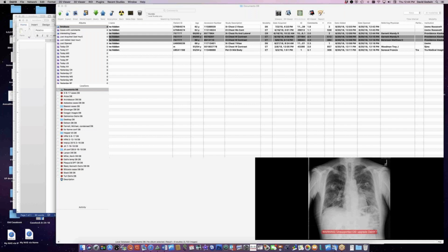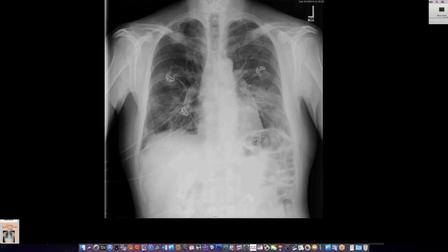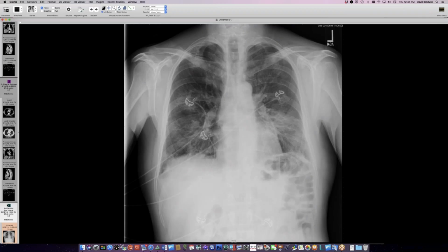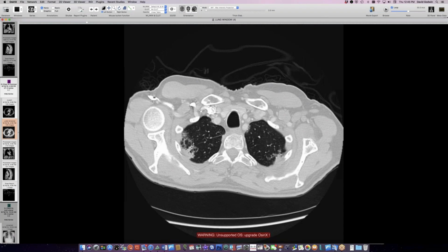Okay, so intracellulare. And then we have this person with rheumatoid arthritis who presented, I think this is June, with patchy lung consolidation. There's not a lot of arthropathy at this point. I still have to get the history on this case, so I'm not quite up on it. And here's what this initial CT scan from outside looked like.